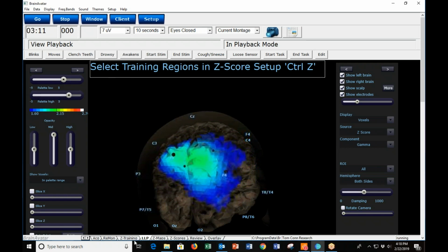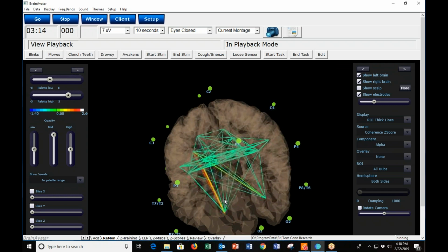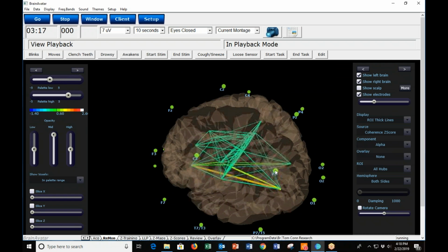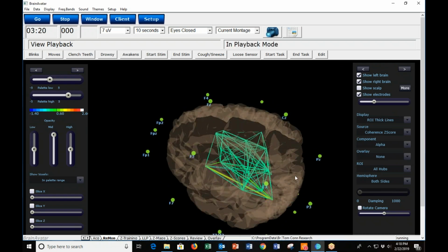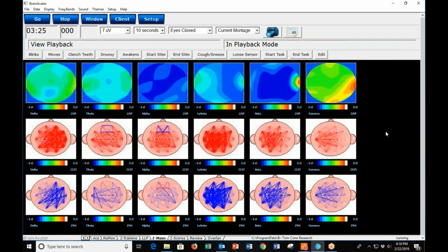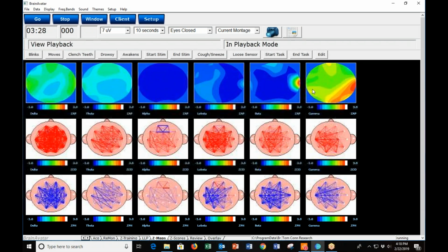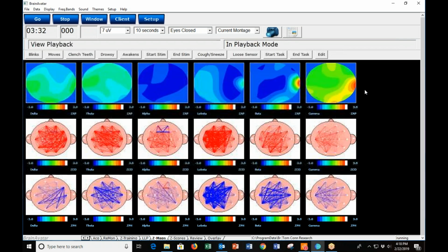So we would look then for F7, I mean Brodmann 7, with regard to any abnormalities. And again, we do see Brodmann 7 here on the right-hand side. So that's just a demonstration of how this tool can be used. We also, of course, have these live surface maps showing the deficits, alpha, low beta, beta, the excessive gamma. We disregard, of course, on the right, that muscle thing.